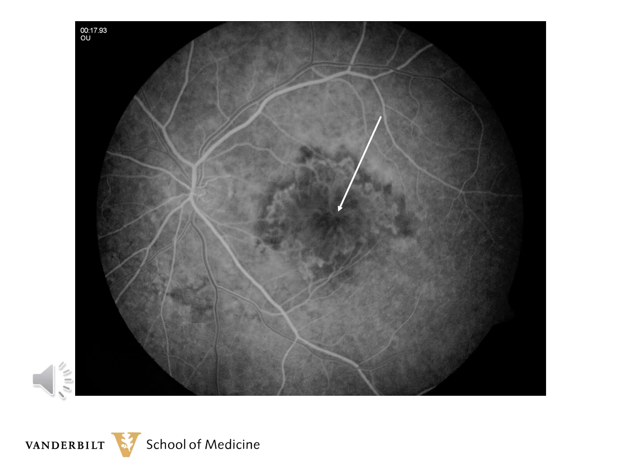This is because the spoke vessels are a bit more mature than the leading edges, and they've developed some tight junctions so they don't leak as much. The leading edge has very immature vessels, and they are hyperfluorescent, and they leak because they do not have tight junctions. Finally, note the dark area at the leading edge. This is where the pigment epithelium is wrapping around the leading edge, which you saw schematically and on the photomicrograph on the last slide.